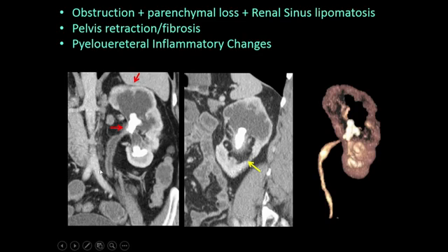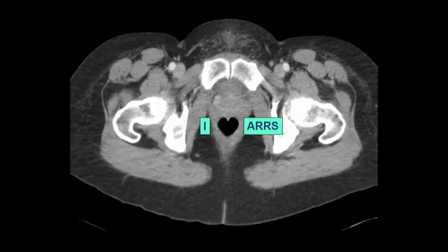Here's a patient who's got lots of things going on. There is a large staghorn calculus, there's atrophy to the parenchyma, blown out calyces, there's pyonephrosis from the thickening and edematous urothelium, and you could see the deposition of the fat in this kidney that will tell the urologist to go in and remove this kidney.